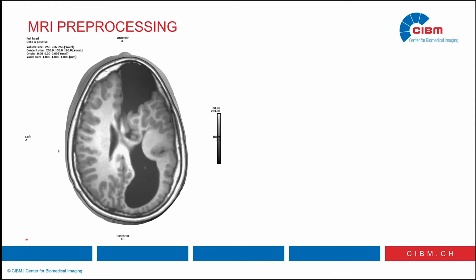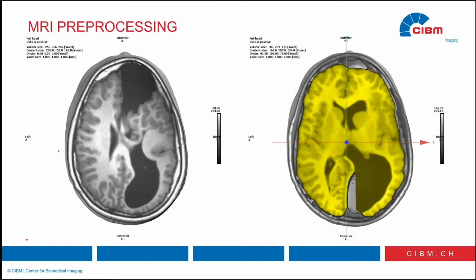And you can see that, yeah, there is something problematic with the brain. But still, we can make it work. Basically, what didn't work, of course, is the AC, the anterior commissure automatic detection. Didn't work, but that's not surprising in our case.